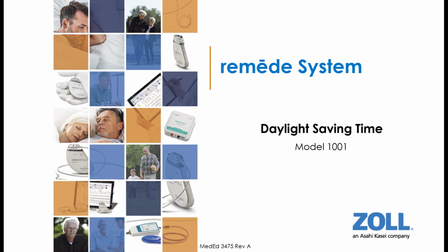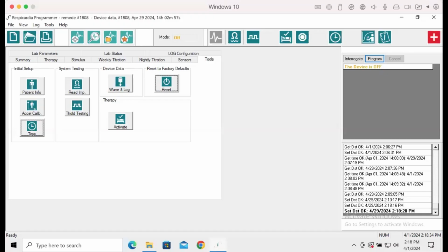Understanding the daylight saving time parameter on Remedy Model 1001. Understanding the daylight saving time parameter and when to use it. Daylight saving time parameter is located within the time icon. The time icon is available in several locations.